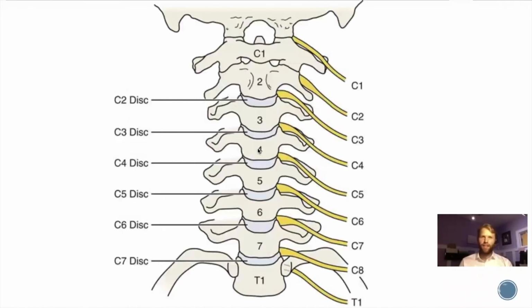So good. This is again just a pure anatomy question. Just remembering that in the cervical spine, the nerve exits above the vertebrae with its namesake. So looking anywhere in the image, you can see that the numbers on the vertebrae correspond to the name that they are in the cervical chain, and that their nerve root exits above them.